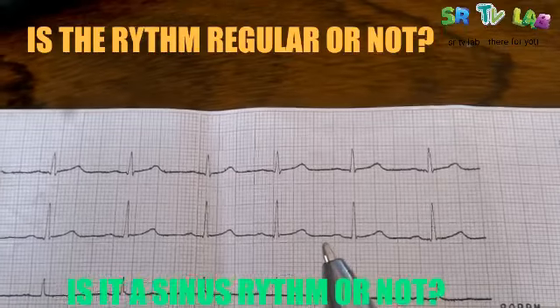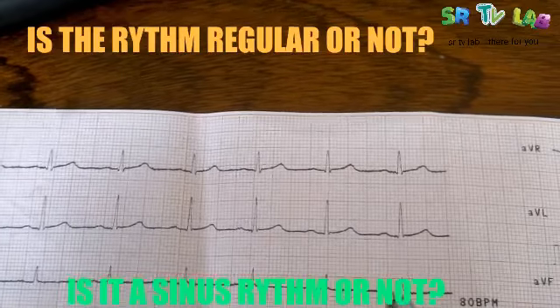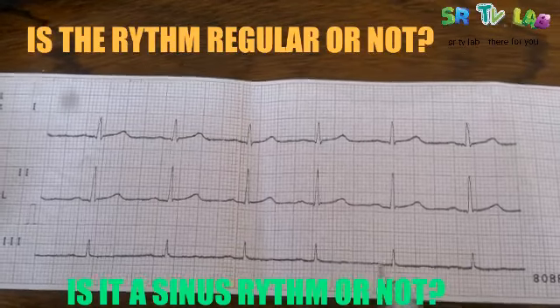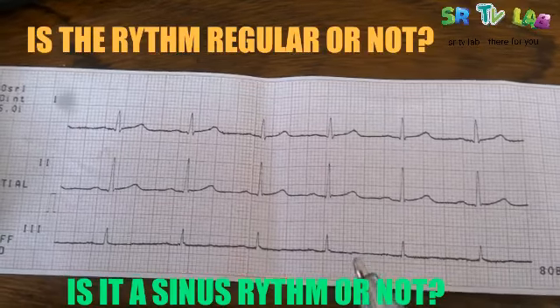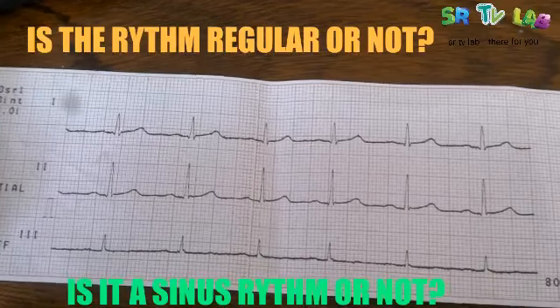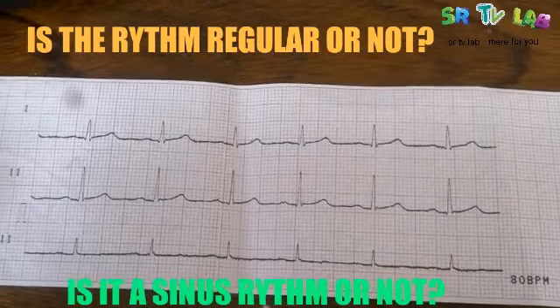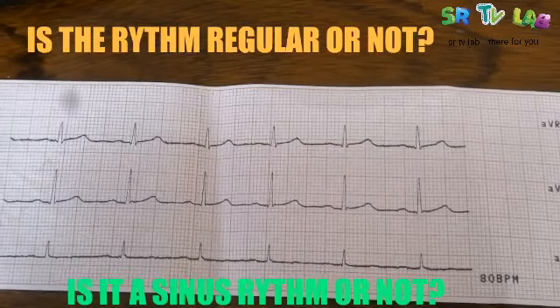So when you find a P wave in any of the limb leads, we can conclude that the rhythm of this person is sinus rhythm. So in this tutorial, we have seen two things. The rhythm regularity: we found that the rhythm is regular. And the origin of the rhythm: we concluded that this rhythm is sinus rhythm.